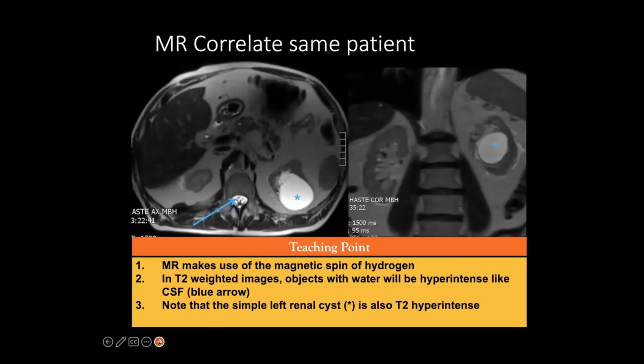And finally, we move to MRI. As Katie said, the bones will be relatively hypointense on MRI. And then we try to decide T1 or T2. The CSF is hyperintense. So this is T2, again, T2H2O. And then we have our renal cyst, which is T2 hyperintense.